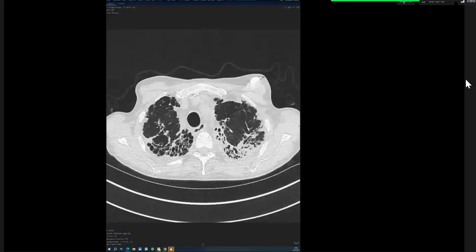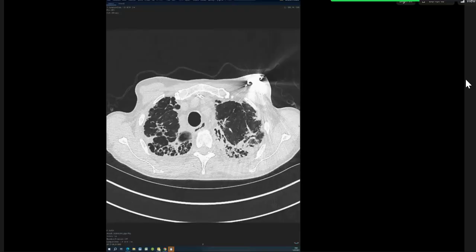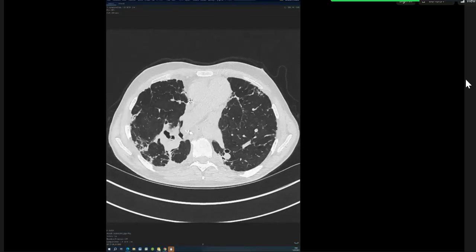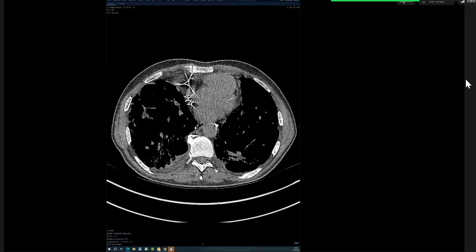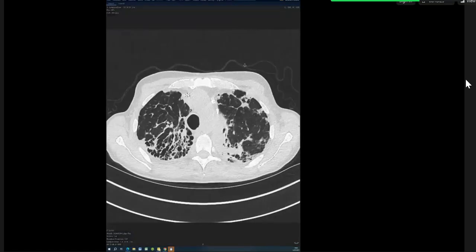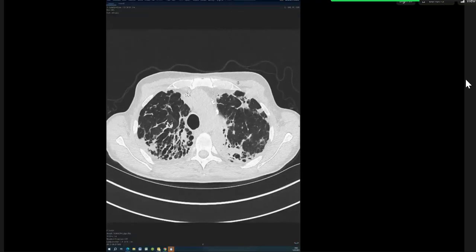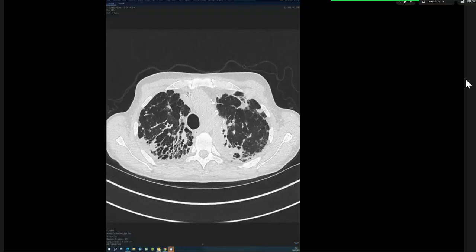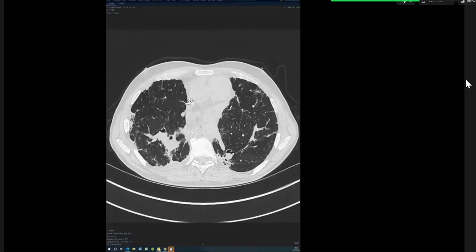So you have a pattern of fibrosis that's quite typical for a disease. This is a posterior pulling of the bronchi. It's almost like somebody standing behind the patient and pulling the lung backwards. It's very typical for stage 4 sarcoidosis. And by stage 4, lymphadenopathy has usually resolved and you have a bit of calcification left. But the posterior pattern of fibrosis is quite typical for sarcoid. If you see that, the expectation would be to think down the sarcoidosis route pretty quickly. And then the next question will be, what stage of sarcoidosis is this? Do you know the stages of sarcoidosis? Can you tell me the stages, which I'm sure you do.